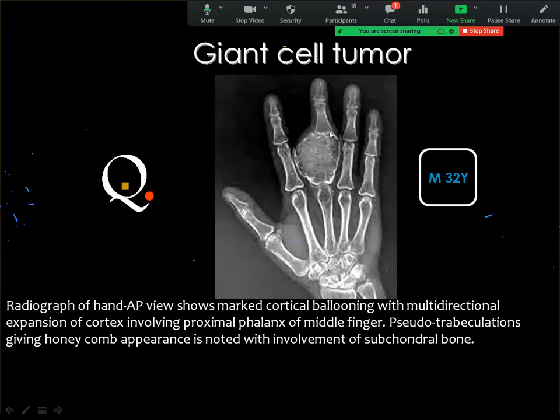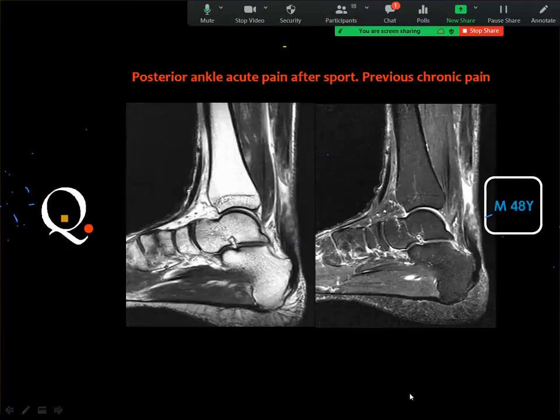The giant cell tumor may contain some trabeculae inside, but actually I went through the literature and I could not find a single criterion that can differentiate between enchondroma and giant cell tumor. So in cases where the age is above the age of epiphyseal closure, then you may consider also giant cell tumor in the differential diagnosis of these tumors in the hand. Next case.